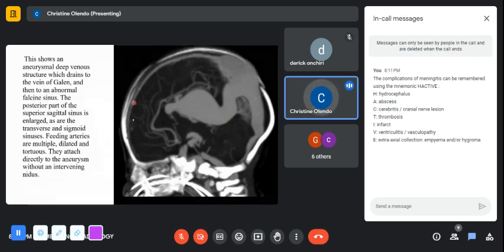Of a fetus, and we saw it. It's showing an aneurysm in the deep venous system, which is here. This is where we're supposed to see the vein of Galen if it was normal, but we're seeing it is ballooned, and there is extension to the falcine sinus, and eventually into the superior sagittal sinus, which is dilated as we go down onto the transverse and the sigmoid at that area.